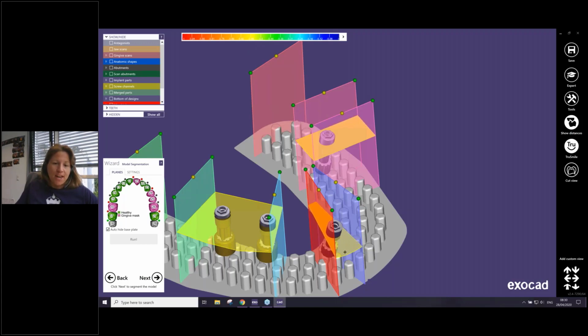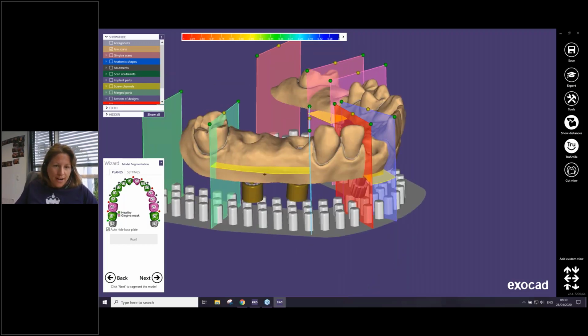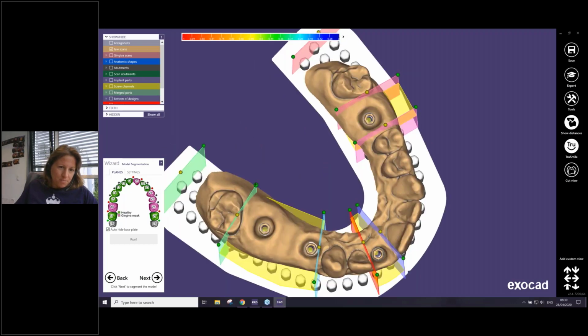Important to know, if you have this type of model, the Gingiva mask or the cut is flat. If you have the next one, the form of the gingiva is not flat on the bottom side. So here we will correct the planes. By clicking also here on these control points in the menu, you can select some more planes if you need one.